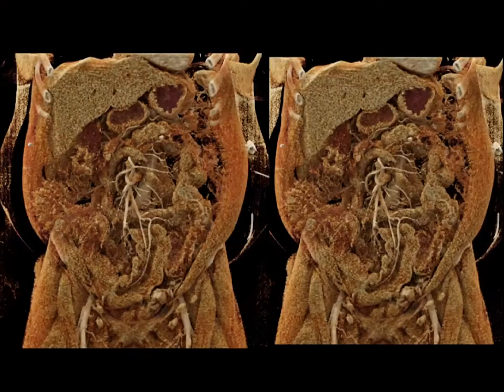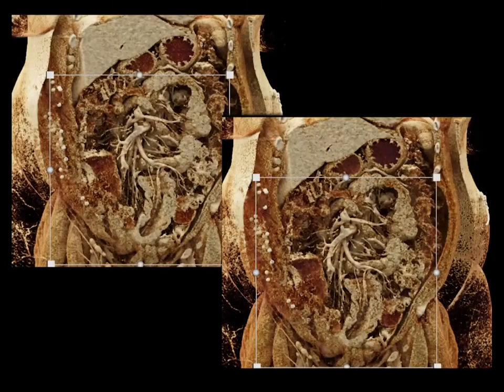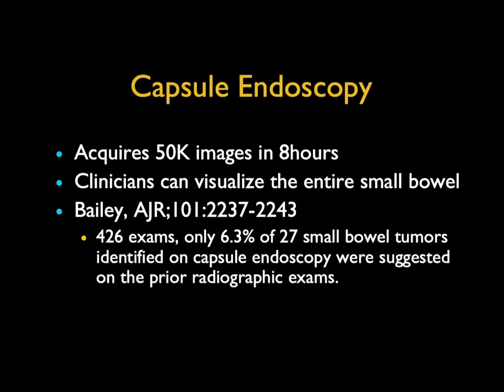And then here's some of the cinematics. So just a beautiful set of images. And here's one more set showing you the intussusception in the proximal ileum, very nicely defined. And this intussusception was intermittent, but was causing the patient's symptoms. Now, CT has gotten very good for looking at bowel.